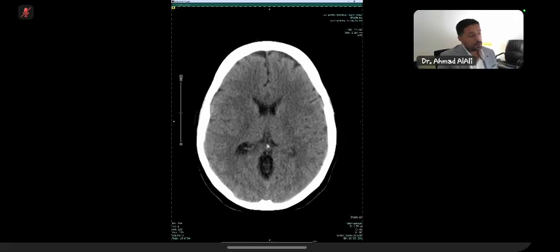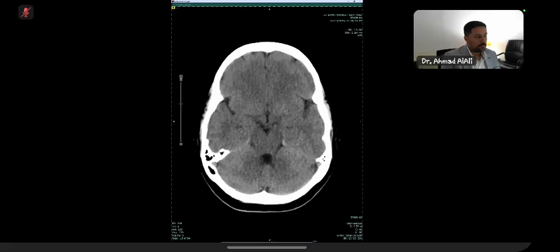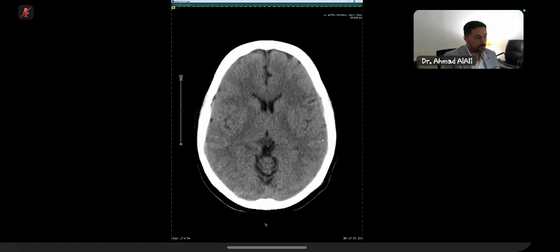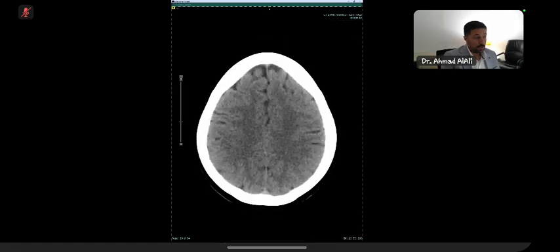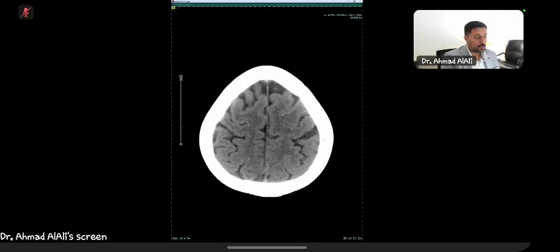So if it is normal in the exam, just tell the candidate that you cannot spot any pathology and proceed to the next image. The examiner might guide you through. So in this case, can you see any pathology in the brain? Anything that you can spot?